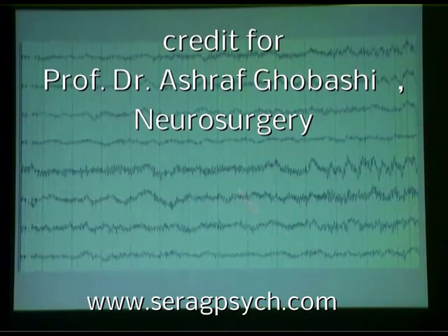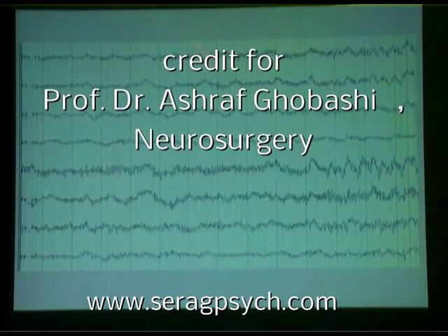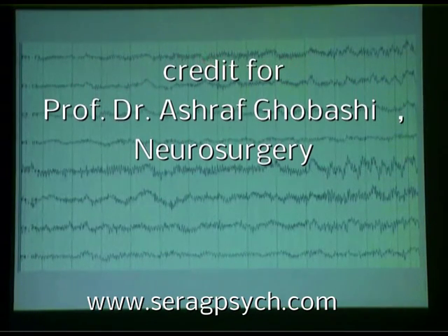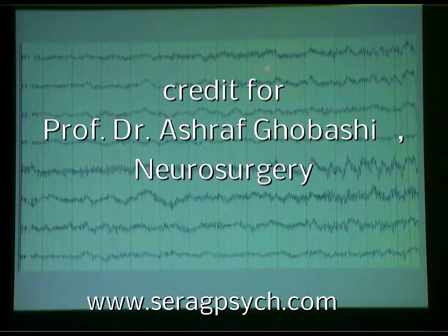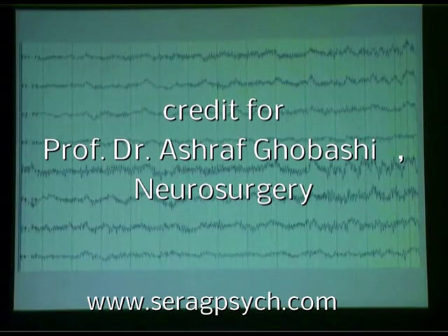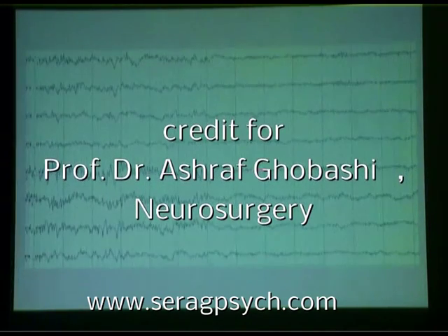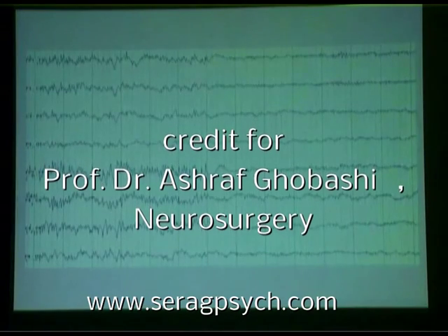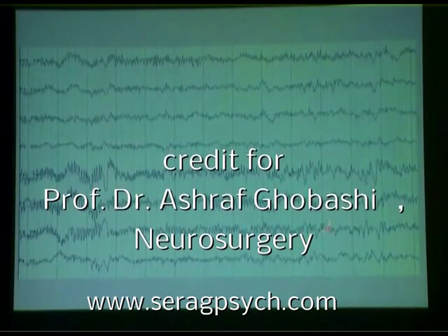This is just continuous spike activity spreading a little bit now over to the left side. You're seeing a more complex high frequency activity. You can see the beta activity in here, and then it's complicated by another beta rhythm coming in there. You can see how complex it's getting. Next, please. And it keeps going. Go back one, please. This keeps going here, becoming sequential spike discharges.